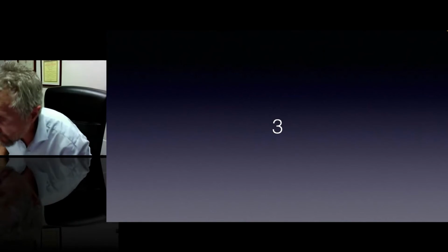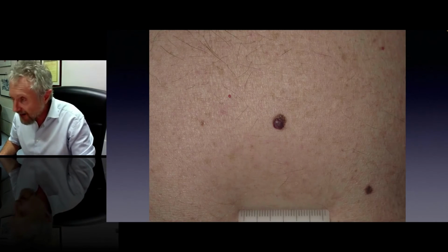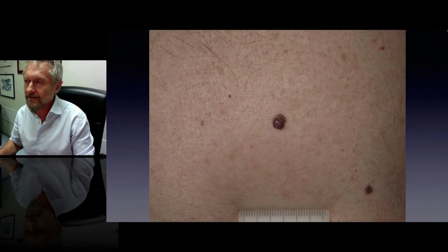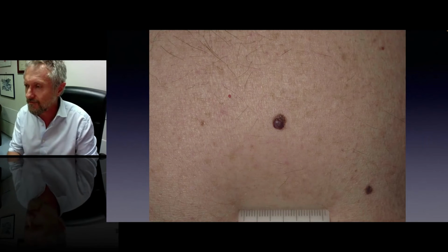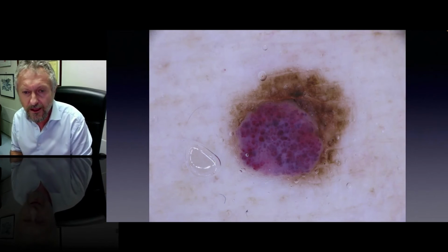Okay, so seborrheic keratoses are very common, so we expect to find them colliding with other lesions, but also nevi are very common, and therefore nevi can be combined not only with a seborrheic keratosis but also, in this particular case, with a beautiful hemangioma.